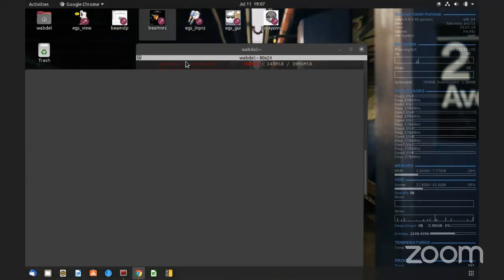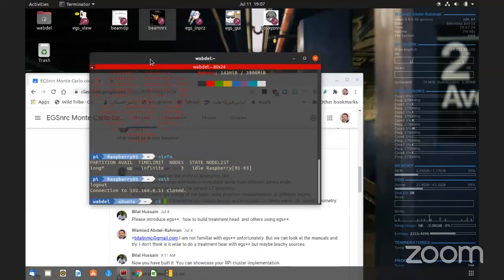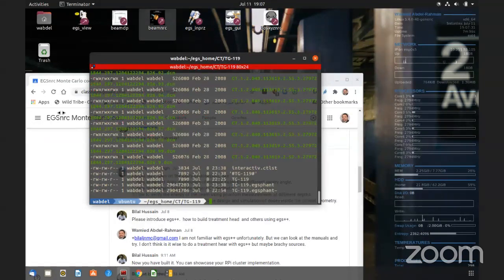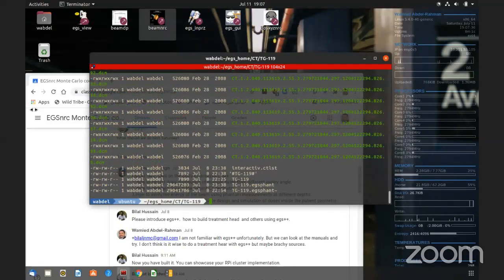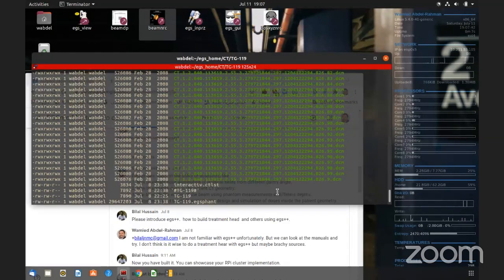So the steps are the following. I have actually downloaded, I brought, these are the DICOM files of a patient. Okay. So here, those in green are just the DICOM files of a patient that we have. How many images? So 129 images, okay?